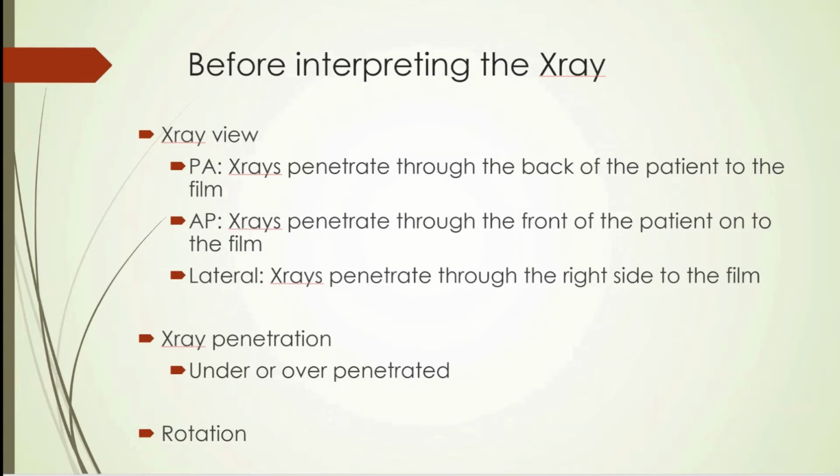A little bit about penetration makes it difficult to read. If it's under-penetrated, you might miss stuff. If it's over-penetrated, you might miss stuff. So make sure the penetration is adequate. Most radiology techs do a good job of this, but occasionally get one that's not ideal, and you may need to repeat it.